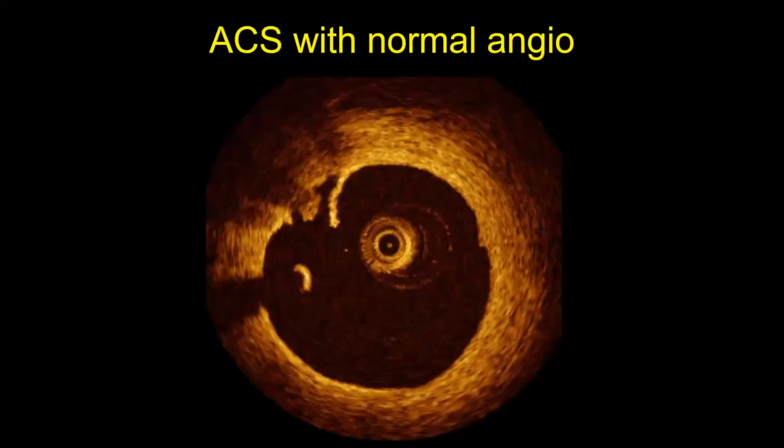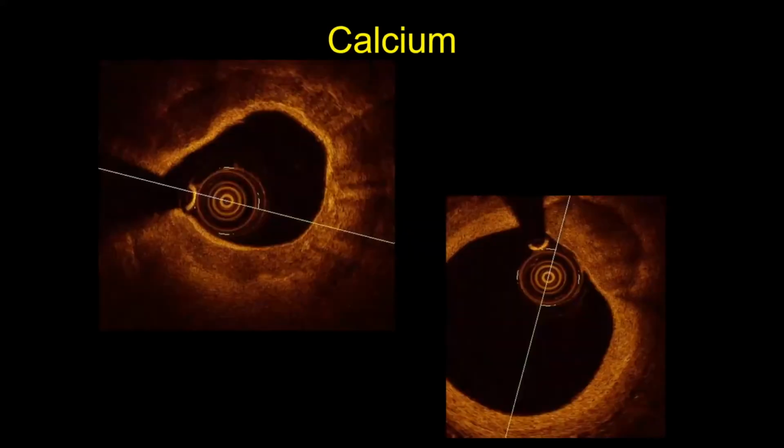Javid, do you mind if I just interrupt and ask you a question on that last slide? Sure. So I tend to reach for IVUS more than OCT, to be honest, and one of the reasons is vessel sizing, which is one of the disadvantages. I would find it difficult to determine where the external elastic lamina is and to size on that. I know we're supposed to take reference vessels either side, but just based on those images, where would you size from and to?